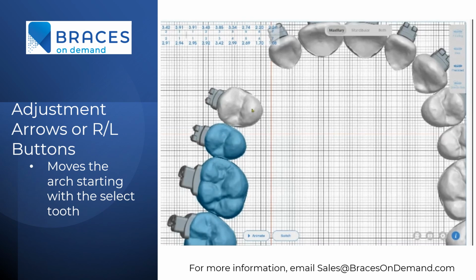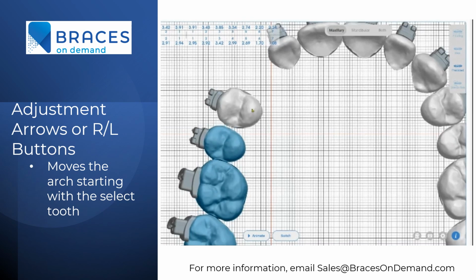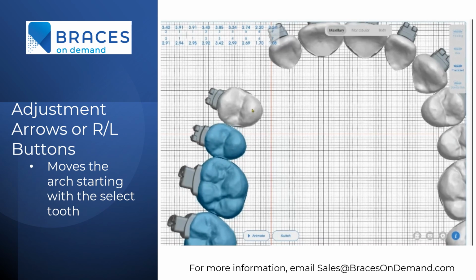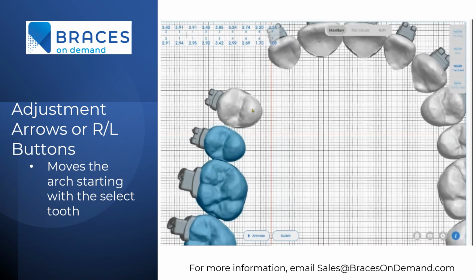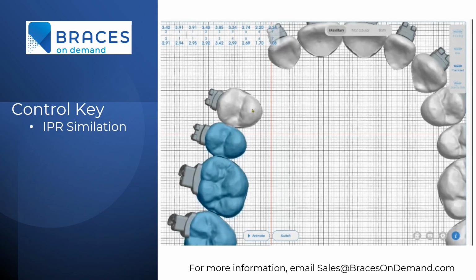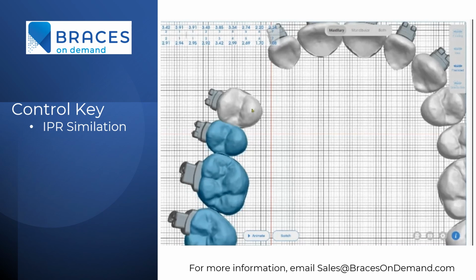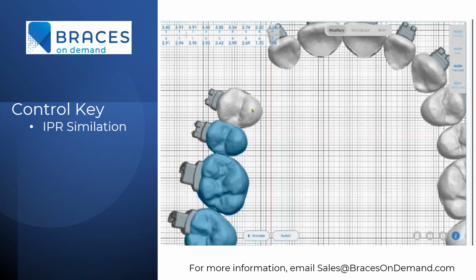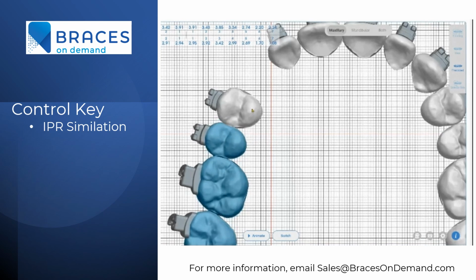So when you see the entire arch moving, when you only want a segment or an individual tooth to move, you need to hold the Shift key while you're clicking your arrow keys, and that will prevent the whole arch from moving. The last useful shortcut key that we're going to be discussing today is the Control key. The Control key allows you to simulate IPR. So in this video here, you can see the segment that we've selected is moving towards the fore and it begins to overlap as if it's simulating IPR.